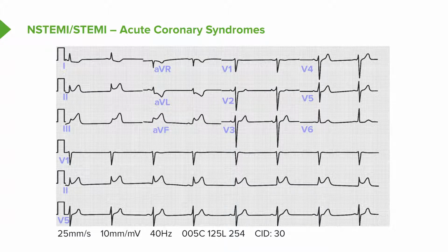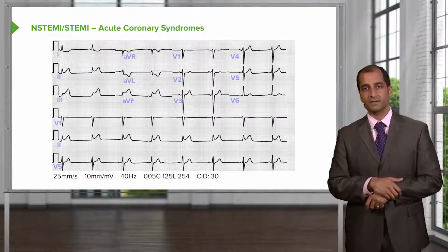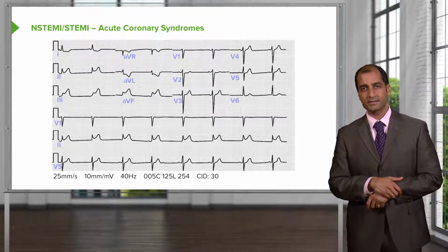If you actually take a look at that ST elevation and that QRS complex collectively, clinically speaking, or just for amusement's sake, it looks like a hat that a fireman might wear. So, ST elevations 2, 3, AVF. What coronary artery, please? Right coronary artery.